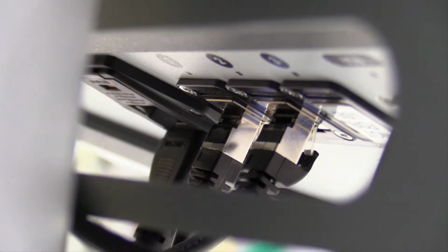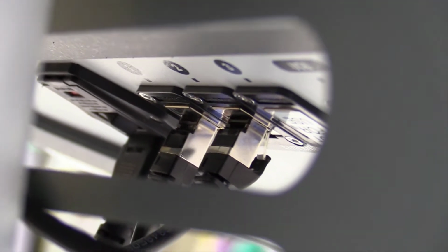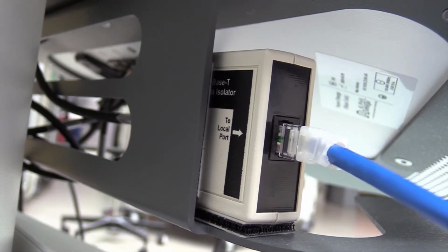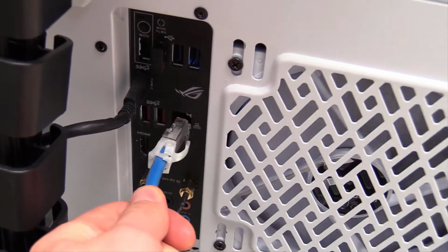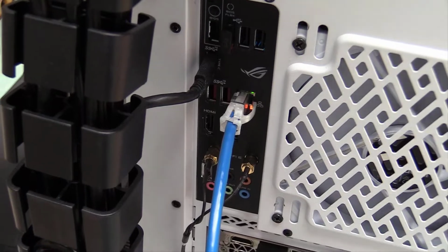The only physical setup between the two systems is the Ethernet cable. On the underside of the Neuro Omega, there are 3 Ethernet ports, but one is usually extended for easy access. Plug it in and connect the other end to the BCI2000 PC. There are 2 configuration settings that must be specified when connecting to the Neuro Omega. The first is the IP address, and the second is the MAC address.